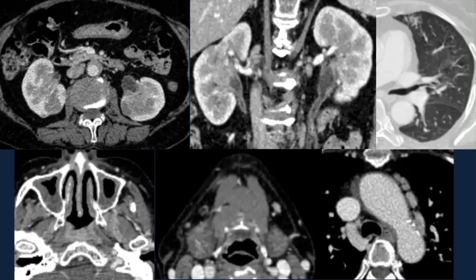CECT was done for this patient, which revealed ill-defined renal cortical lesions. Alongside the ill-defined renal cortical lesions, there was also presence of periaortitis here. Pelvic wall thickening was also present. There was bronchial wall thickening along with centrilobular nodules. Pharyngitis was present, as well as mucosal thickening involving the paranasal sinuses. There was also presence of submandibular gland involvement with a small focus of mediastinitis, along with mediastinal lymph nodes here.